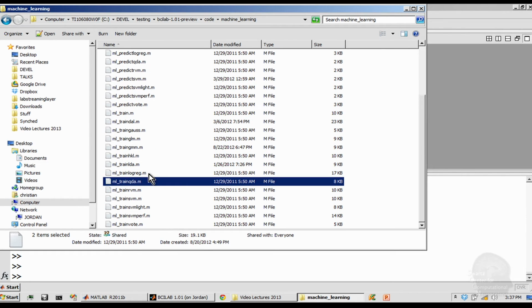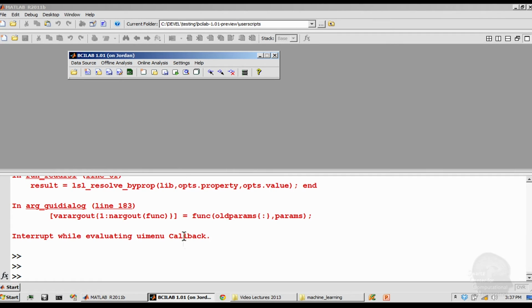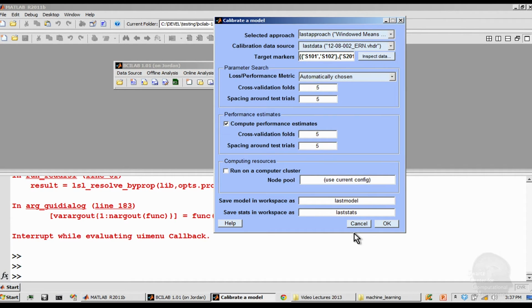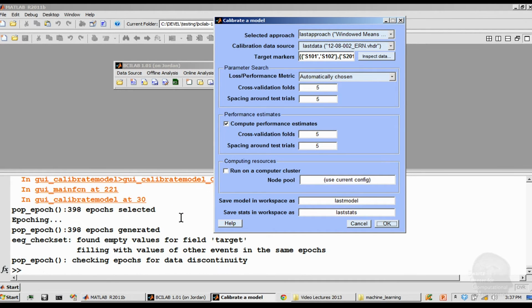You could look at the code and read the documentation, and I'll show you some plugins by the end of this. But before we really dive into the plugins, I'll just train a model with this approach, reusing all the same defaults that we just had. And now it'll crunch probably a little bit longer because the logistic regression is a little bit slower than LDA.